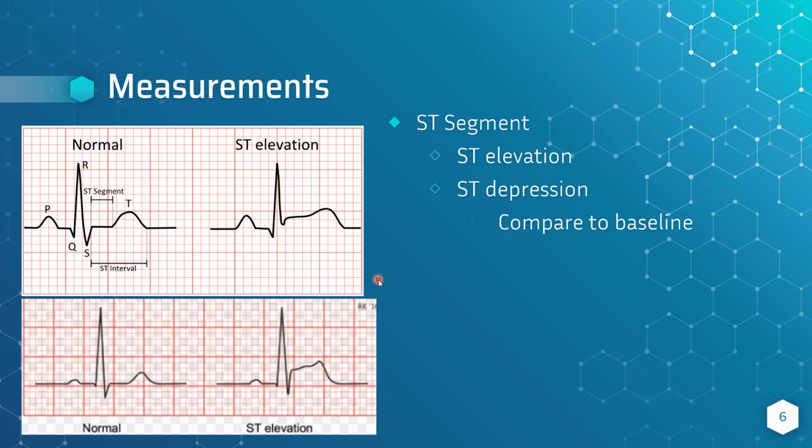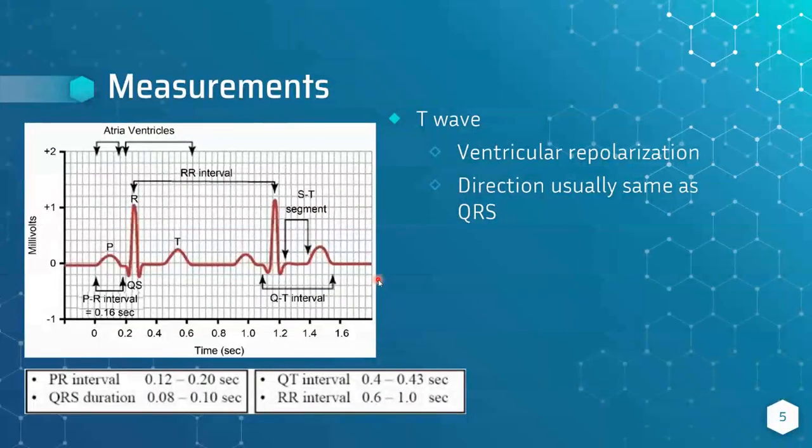And then things that we're familiar with, so ST segment. So going from the last slide, you can tell here where you actually measure that from. And then here's also the QT, which we'll talk about next, and then the PR interval. And then also your R to R here. And remember, when we look at R to R's, it's from the first R to the next R.